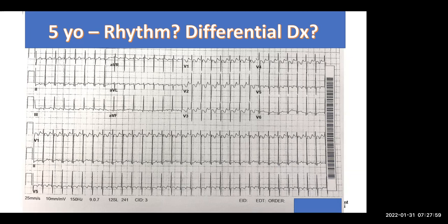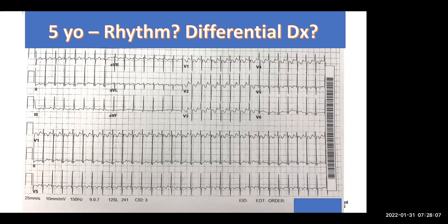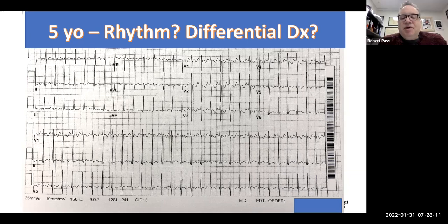PJRT is another differential with a long RP interval. Right, so this could be PJRT also, exactly. And if you're in the emergency department and you're seeing this patient, how could you determine the difference between them? How would you know which of these this is? And that would be the correct differential.